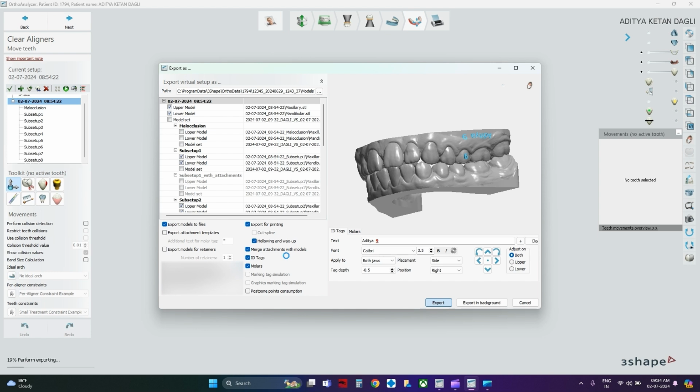because in a normal case scenario I had to go in and hollow out each and every model if I want to print hollow models. But over here, everything is ready and I can directly start slicing and printing the models. So I think it's a great feature for a very nominal fee. So please give it a shot.